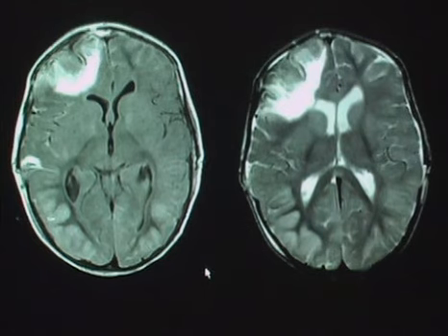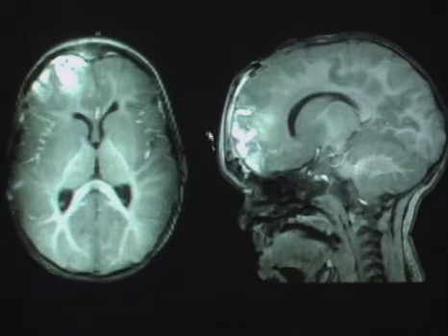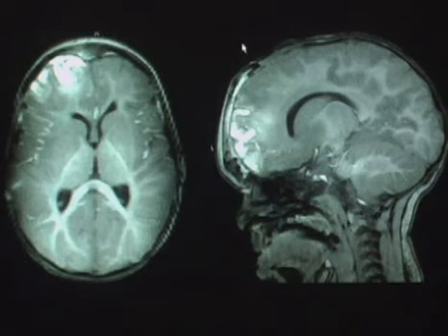Here's another example of direct extension of disease to cause a cerebritis. On the FLAIR imaging and T2 weighted imaging, what we have is extensive signal abnormality and mass effect involving the right frontal lobe. What becomes less apparent is that there's some slight extraaxial collections that we can see here in the T2 weighted imaging. When we take a look at the post-contrast imaging and we use our multiplanar reformatting capability to look at the images further, what we notice is that there's also abnormal enhancement within the calvarium, and that this was a patient who had a craniotomy, and what ended up happening was that there was infected craniotomy segment with direct extension of disease to cause a cerebritis in this patient.